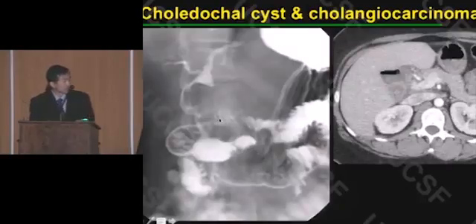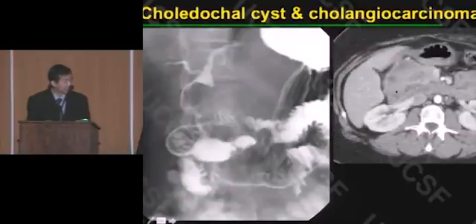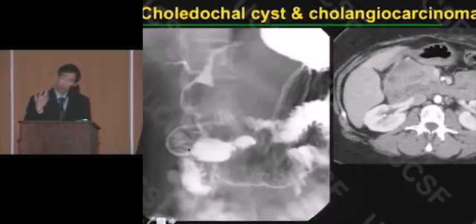This is a choledochal cyst. It should be a big fusiform cyst, but look, there's a giant cholangiocarcinoma filling this cyst, and here it is on CT. This is a 29-year-old woman. She was totally healthy, looked great, had her whole world in front of her, and the surgeon had just decompressed her biliary tract by suturing her duct to a piece of duodenum, thereby curing her symptoms when she was a baby. And then she never had a completion cystectomy.